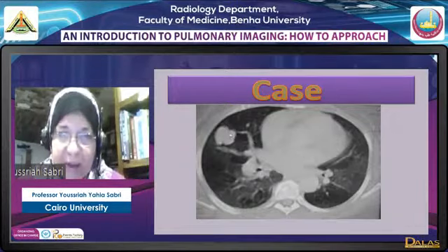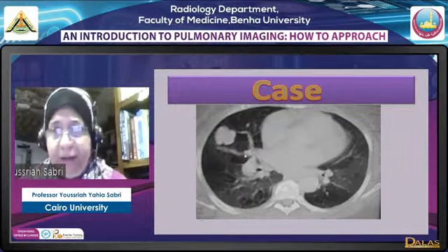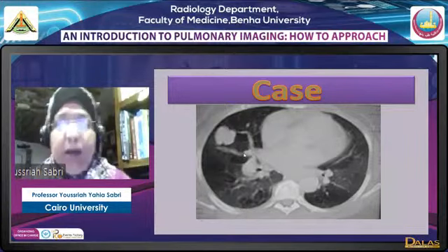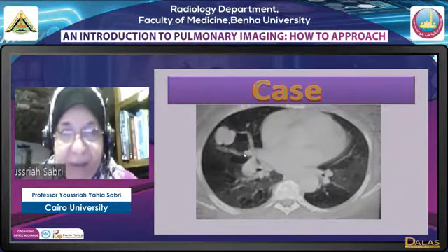So when we have a peripheral lesion with lobulated or smooth outline, whether a nodular mass, with markedly prominent vessels supplying it, this is an AVM. If we have an AVM, okay, I have diagnosed an AVM, is that enough? No, we won't settle for this. A CT pulmonary angiogram must be done.